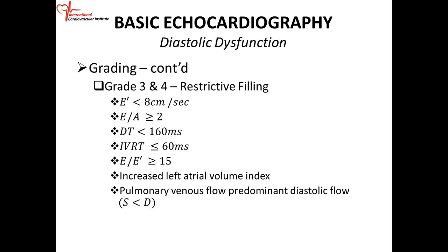Then we have grade 3 and 4. Now, grade 3 and 4 looks the same. Okay? And this is a worse stage of diastolic dysfunction. And we call this, the patient is now having a problem with filling, the restrictive filling.